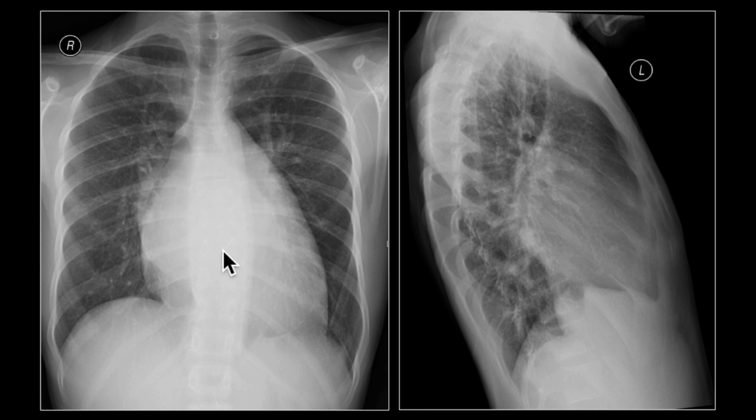Once you finish the cardiac findings, go directly to assess the effect on the lungs. That's very important because the next question would be related to what's happening to the lungs secondary to the heart. In more specific terms, whenever you see a cardiac problem, make sure you don't have pulmonary edema plus or minus pleural effusions. For the pleural effusion question, this is easy. We don't see any pleural effusion here.